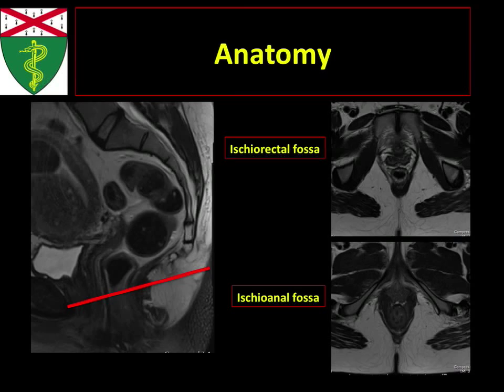So I cheat. I don't need to call it cheating, but look at all the images that you get. Look at your sagittals, and just pinpoint whether you are above or below that puborectalis muscle so you can name things appropriately. Ultimately, it probably doesn't really matter what you name it in your reports, but for our purposes, we want to be as accurate as possible.